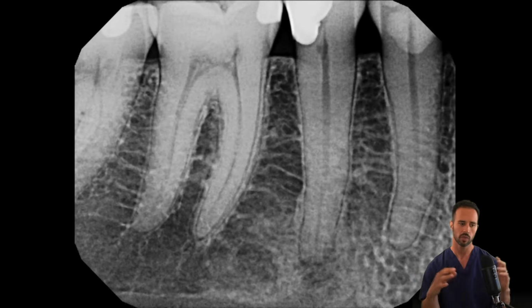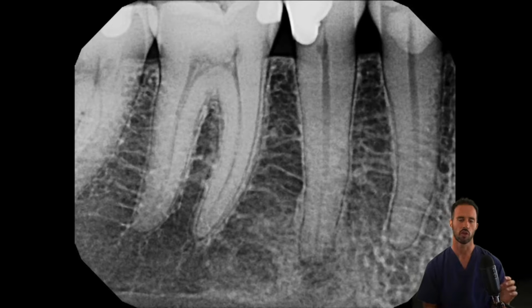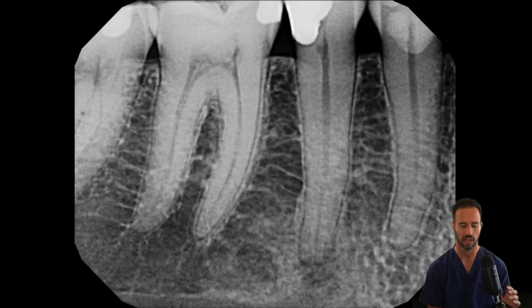And you always want to take a bite wing radiograph as well as a periapical radiograph, and we're going to go through those with you. And so you can see very clearly on the periapical film that the restoration appears to be, even on the PA, very, very close to the pulp. And you can hopefully see that lesion on tooth number 29 in the apical area.